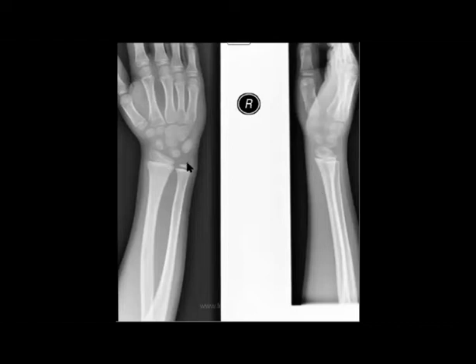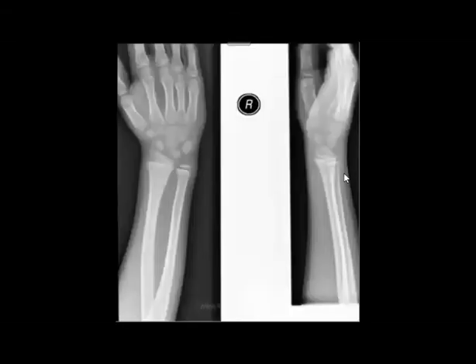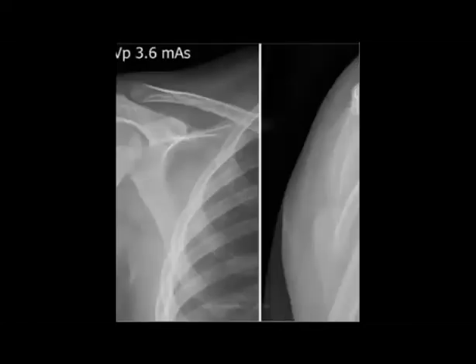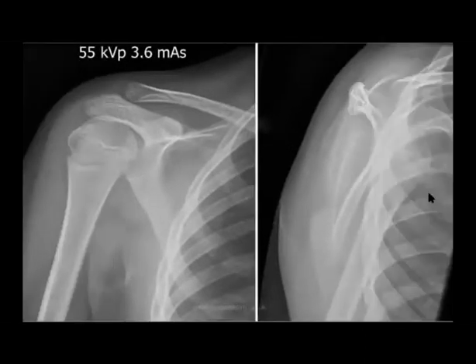If you go and mention in this case that it is normal, then it will be wrong. So you should check slowly and rapidly at the same time, in an accurate way.